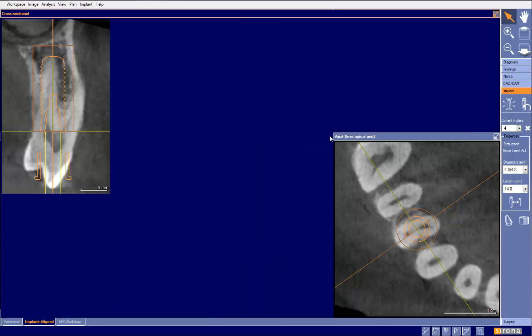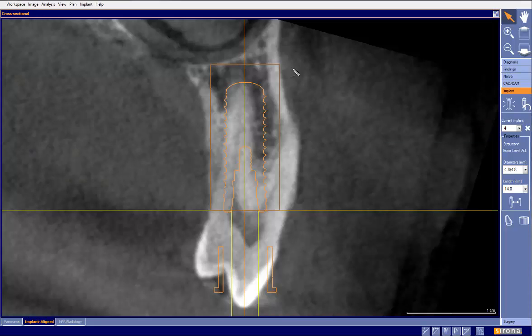And again, if we look at this particular situation and using our drawing tools here, I'm able to outline what looks to be the bone level here, just like so. And we can see that we have a little bit more space on the buccal right here, but not so much here. So I wouldn't necessarily move this more buccal, but I would point out that it looks like we're definitely supracrestal, above the bone. And in immediate placement, we definitely do not want to be above the bone there.